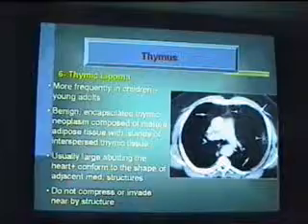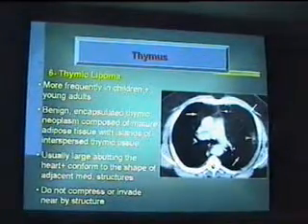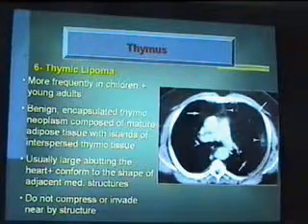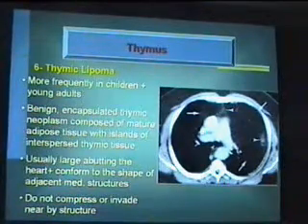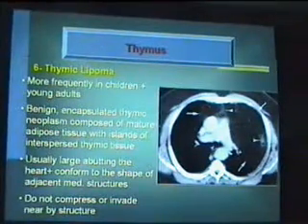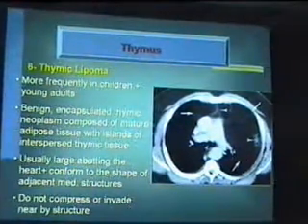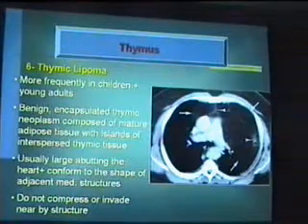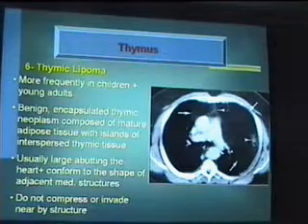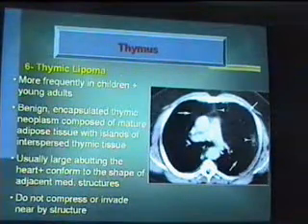نيجي بقى لحاجة اسمها thymic lipoma. إحنا قلنا إن بيحصل fat deposition of the thymus. Sometimes this fat becomes localized ويديني what we call الليبوما وتكبر قوي قوي كده. شايفين مساحتها هتروح فين يا جماعة؟ ومع ذلك مش عاملة أي ديسبليسمنت. البالمونري أرتري in place، الأسندنج أورتا in place، الكافا in place، nothing is displaced. Why?